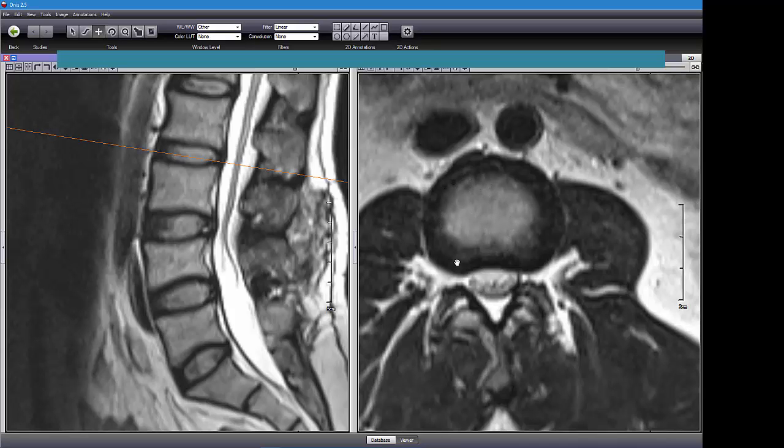This is the axial view. Here's the annulus fibrosus made up of about 20 lamellae. There's those vessels we talked about already, psoas muscles. Multifidi muscles are here. The erector spinae muscles would be out here. There's a thecal sac. Not a very good quality MRI, but you can see the thecal sac. You can see the nerve roots hanging out in there.